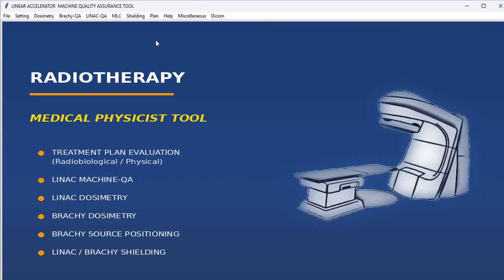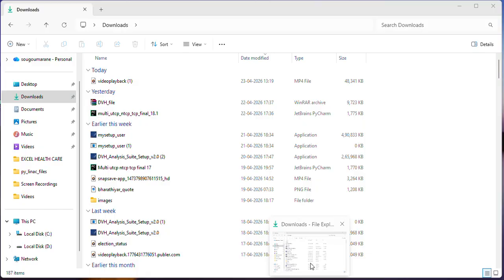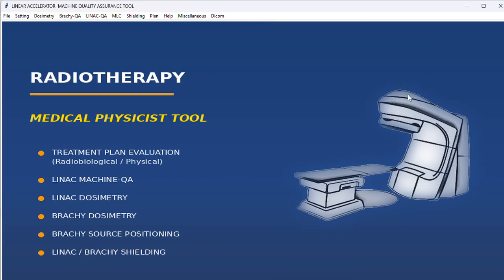Those data are stored in the SQL database and retrieved dynamically during the execution of the application. The simple thing is only the text file as a DVH. I can show you the file.